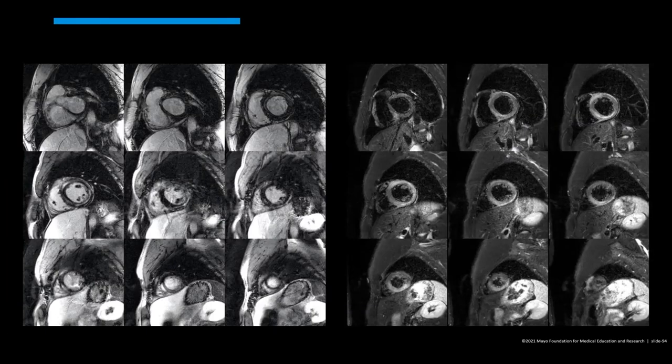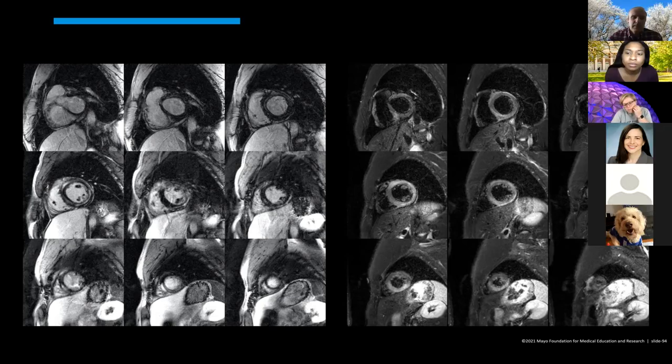And so really, in this case, the differential is also very limited. It's really just myocarditis. Some people have described slightly elevated T2 signal in cardiac sarcoid when you have active inflammation. In my experience, it's not this extensive. I guess theoretically it could happen, but the most likely diagnosis given these images is myocarditis.